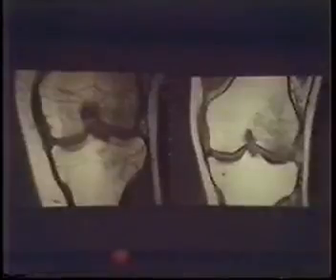I've had recently a number of cases sent to me from around the country of professional athletes where they found some funny signal in the bone and didn't know what to make of it. And those are people who had this kind of a fracture. And the important thing, this typically is seen in people, and this is a little bit later in the disease process. He actually had a medial collateral ligament tear here. You can see the thickening in here, but this is 2 or 3 weeks later, so it's starting to heal.